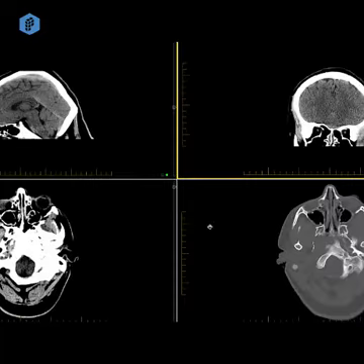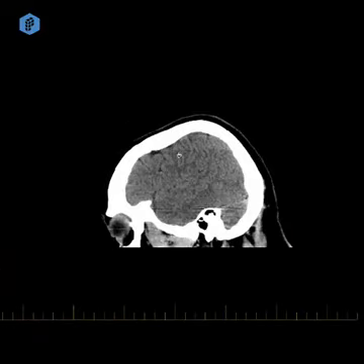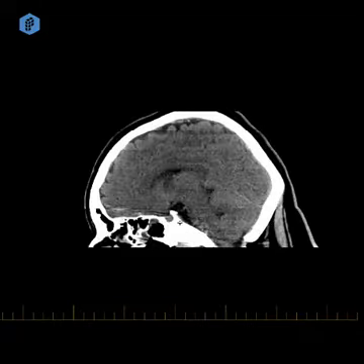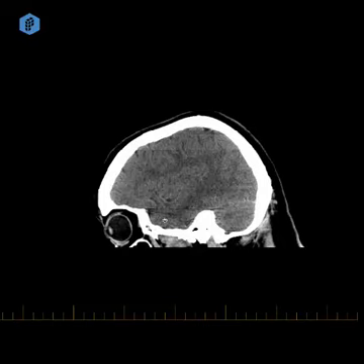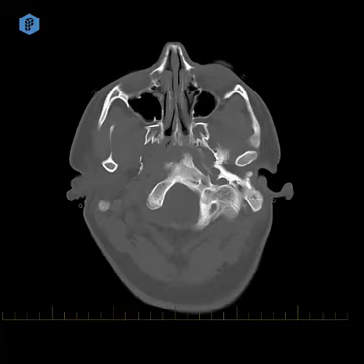object. And if you have time, I would suggest that you look at the sagittal reformats as well, because you can look at the anterior aspect of the temporal lobe much better. You can look at the lateral aspect of it, and also you can look at the midbrain structures. And finally, I will look at the extracranial structures, the bones and soft tissues.